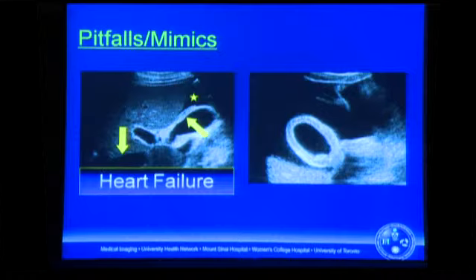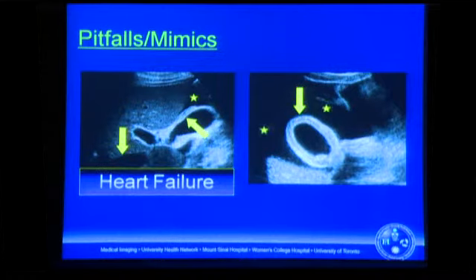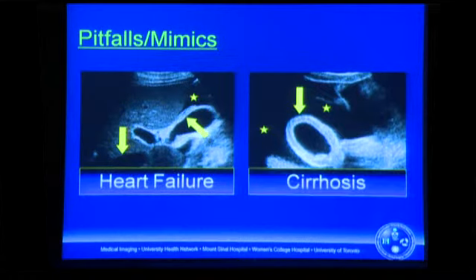Or the patient on your right, gallstone, there's gallbladder wall thickening, there's quite massive ascites, and although we don't see very much of the liver here, the liver had a nodular contour, so this is a cirrhotic liver.